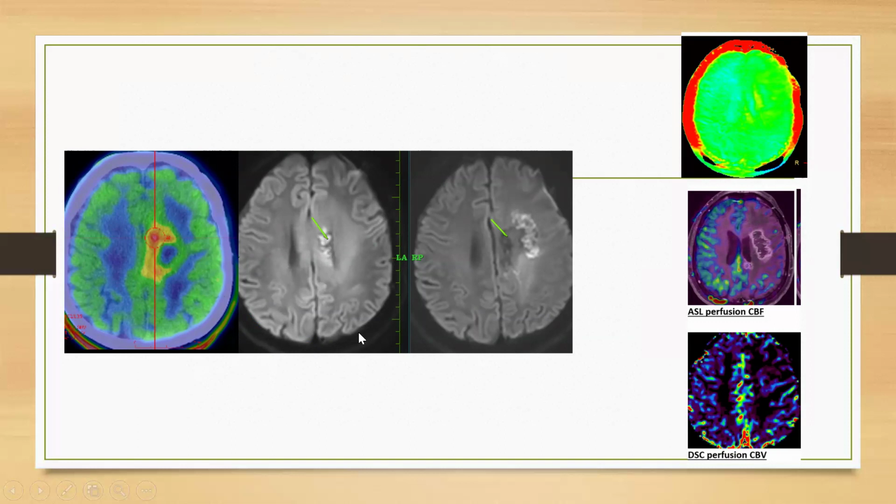And on follow-up after a few months, we saw that there was complete disappearance of the treatment-related changes at the corpus callosum, and there were new changes in the remaining left frontal lobe white matter. Actually, this is also a treatment-related change. These treatment changes have resolved and new treatment changes occurred, and we did perfusion in CBV and APT, and all showed low values. Usually we make the diagnosis based on a combination of all these imaging methods.